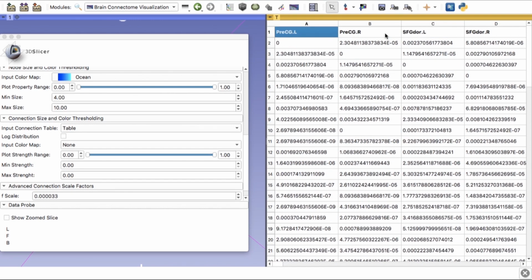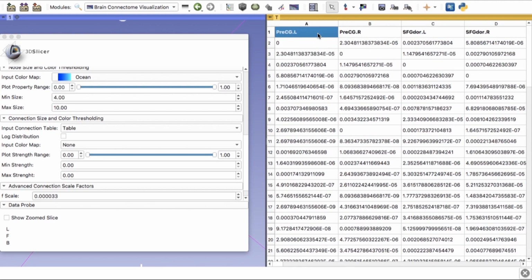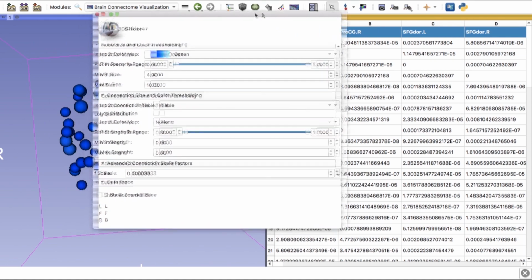You really need strings as a header because otherwise your matrix won't load correctly. Because this module is basically considering that all the tables that you're loading have a header, okay? So just load a header, you can write whatever you want, and then the matrix. And then the code is written so that we only take the values starting from row 1, considering that this is row 0. Okay. Very well.